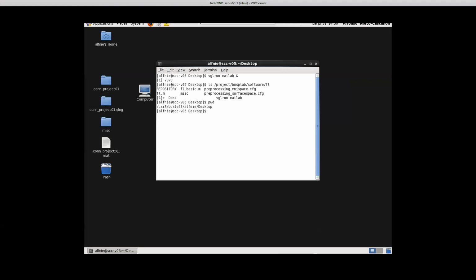So we have vertices. Well, within that surface, we have individual vertices, right? And we have a lot of them. We have close to 200,000 vertices. So this is a very finely detailed interpolation of that individual surface, or of that representation of that individual subject. The distance between two vertices is perhaps, I don't know, 0.2 millimeters. It's very, very close. It's a very dense interpolation, well, representation of the surface in terms of individual vertices.